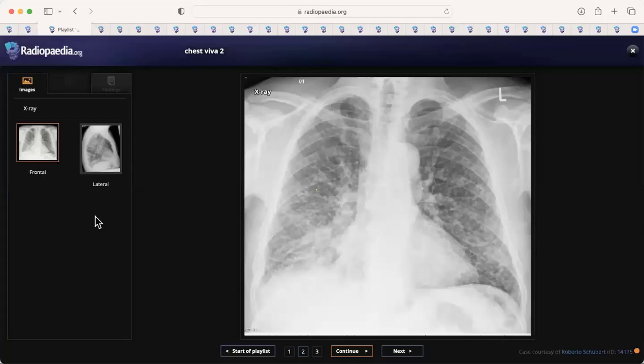So what's the general pattern? You said reticular. Can you see anything else? Yes, there is diffuse reticular opacity. And what is it causing? Does it cause anything in specific? I think there are some cysts seen at both lungs. Can you see these tiny things here? I'm just pointing at them. Yes. So does it change the appearance? What do you think?